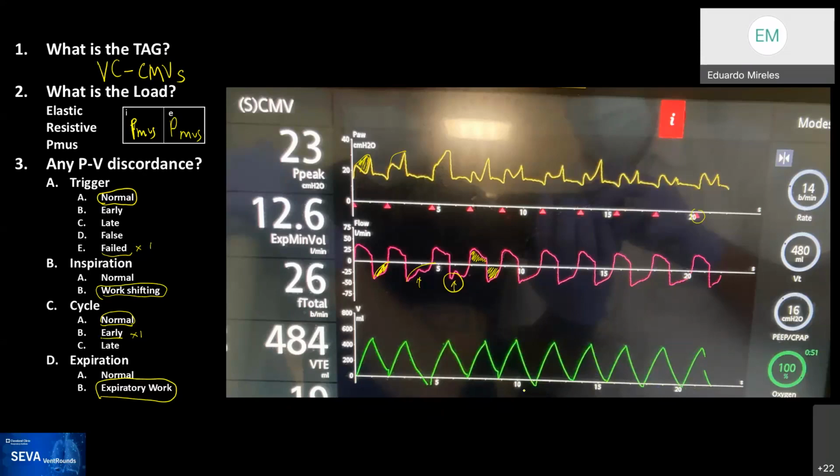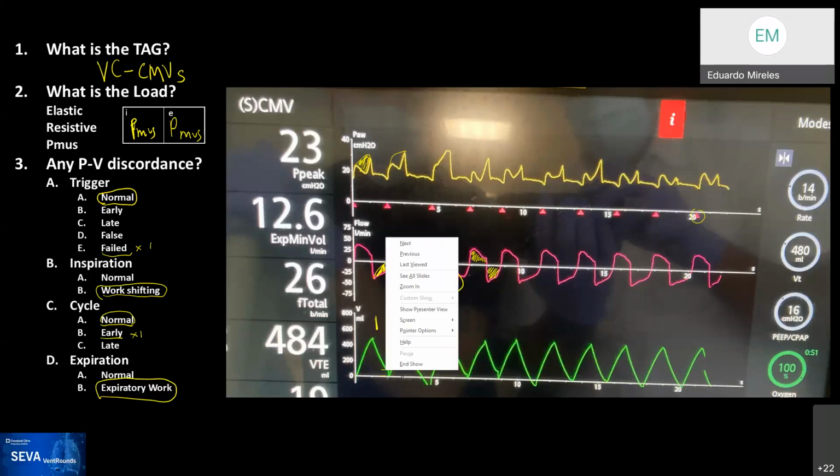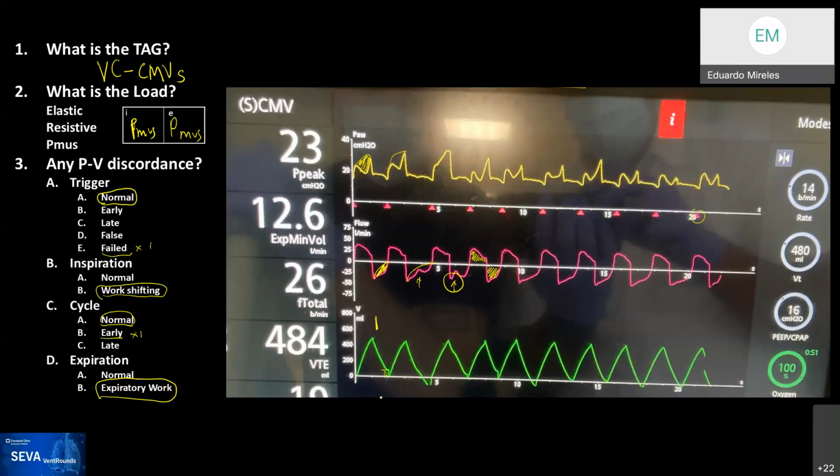Excellent thought process. And actually this is a good item. So let's start with the first breath. Okay, so this is the first breath. And if we see the patient got this amount of tidal volume, then exhaled, and then after the patient exhaled, the patient started another breath, right? But there's a difference, which is this amount of difference, which you call the square root sign. So that difference could be a leak, or it could be air that stayed inside the patient, right?